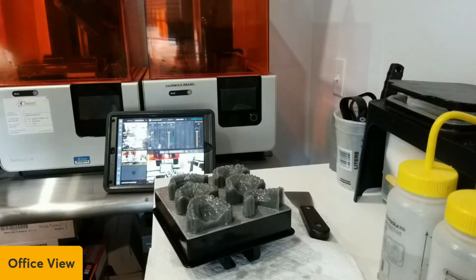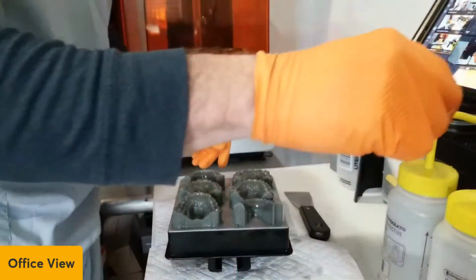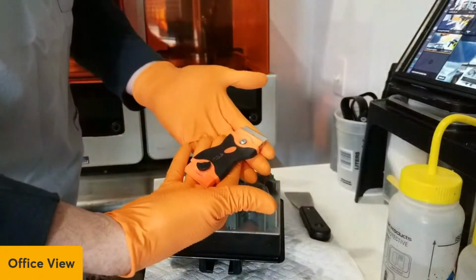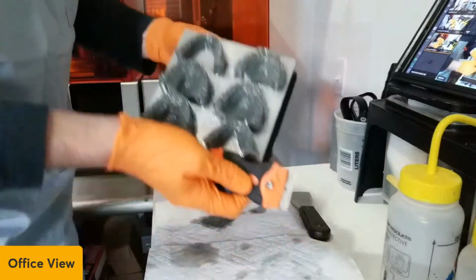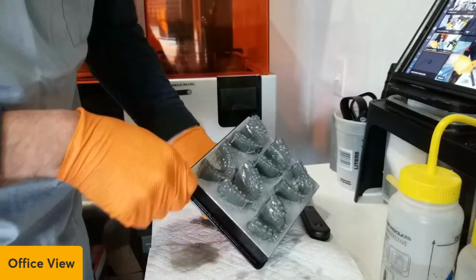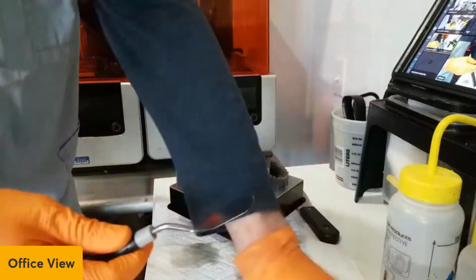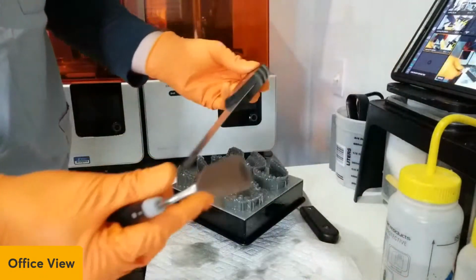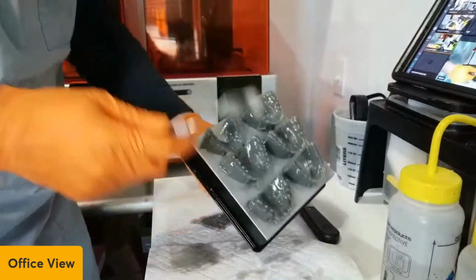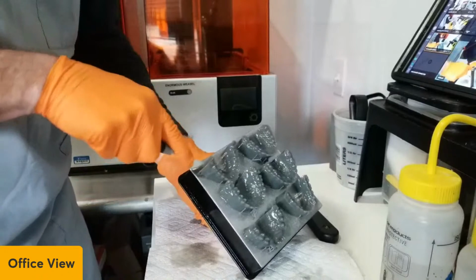Get the right camera angle on here. So this one doesn't have that quick release thing. So I have to use a razor blade. Okay, and I just gently slide up underneath the corner. There we go. And then I have ordered this off Amazon. So this is a 3D print tool you can order. Comes with this thing too, and I have no idea what to use that for. I guess to take off certain models. But I like this one because I can get up underneath the print like that, and slide it off without breaking.